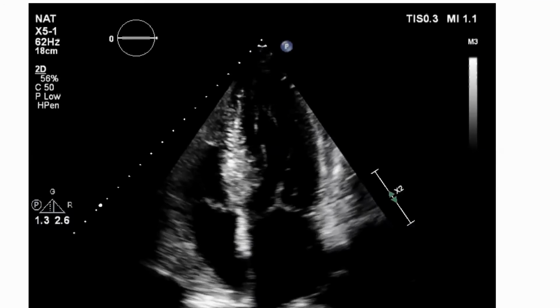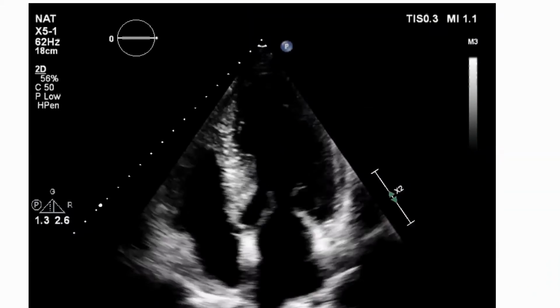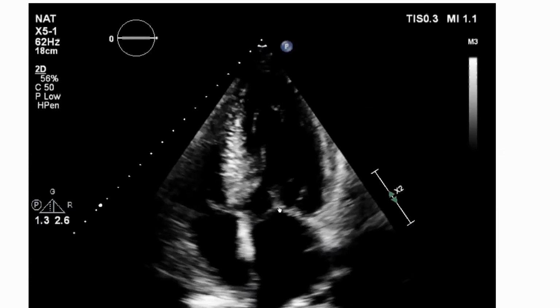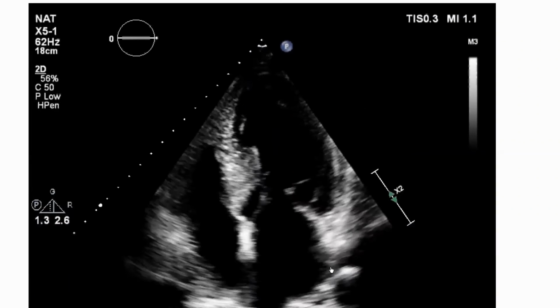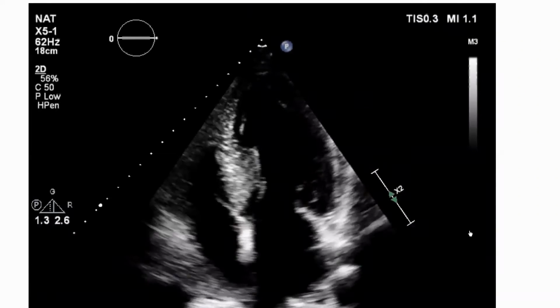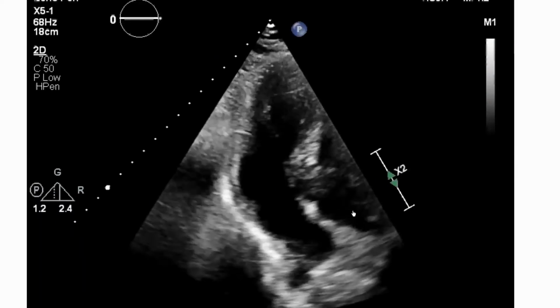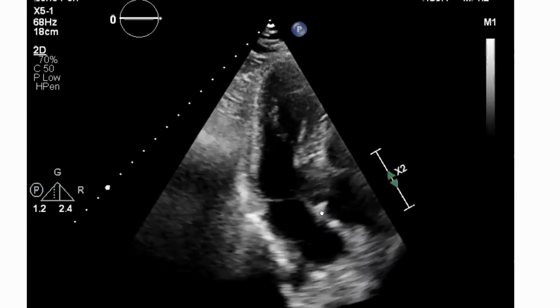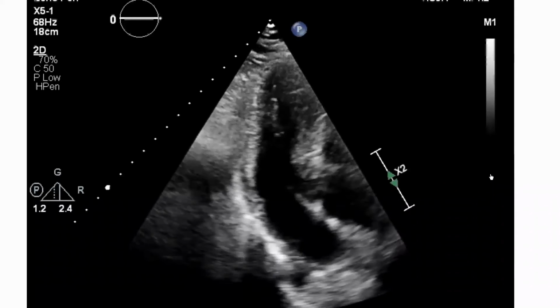Yeah. So here is a 2D picture, 4-chamber view, and as you can see here, it's a fairly classical movement of the mitral valve and the apparatus towards this pretty chunky septum. And in another view, although it didn't look as significant on the apical 4, certainly on the apical long axis, you can see the systolic contact is fairly significant.